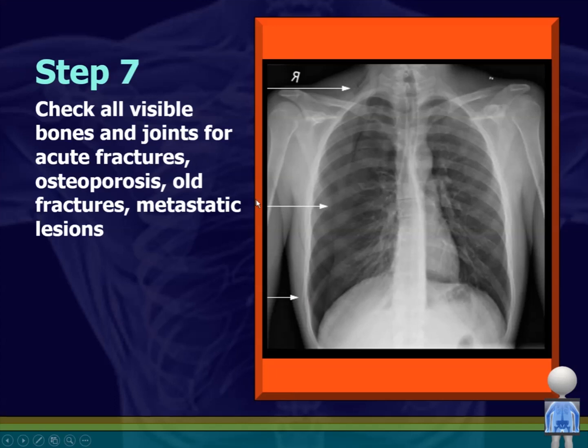This patient also has subcutaneous emphysema. So we asked in step 6, that's one of the things you look for in the x-ray. It's also something that's a physical exam finding that's pretty impressive. And you see here, because of the pneumothorax, some of the air has escaped up into the upper area, into the interstitial tissue, and caused subcu emphysema. You see the dark in here? That's air trapped inside the tissue. If you were to touch this person here and push, it would sound like Rice Krispies, all a little popping going on. It's very interesting when you see it in person.